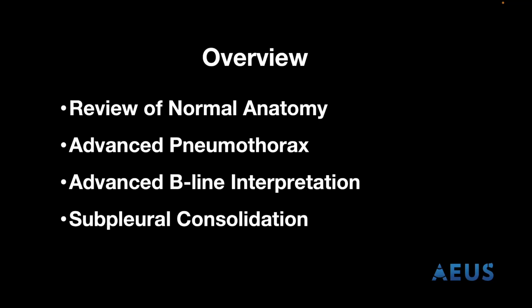Our goals will parallel the framework and focus clinical questions that are answered with basic lung ultrasound. We'll talk about normal lung and how you know if you have the optimized view. Then we'll get into some higher level skills for pneumothorax evaluation, alveolar interstitial syndrome with B-lines, and finally, lung consolidation.